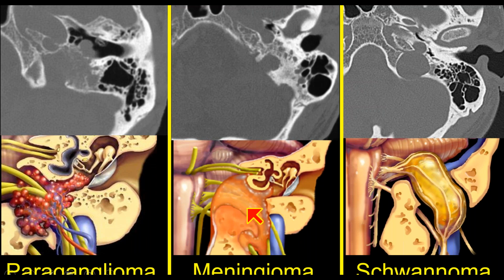A meningioma has dural tails, usually avidly enhancing, may calcify, and a schwannoma, when they get big enough, has intratumoral cysts. So we want to think about the osseous change, we want to think about the vector of spread, and we want to think about the MRI characteristics. This is very important for us because we have a CT and a post-contrasted MR. We can sometimes tell you exactly what the pathology is at this location.